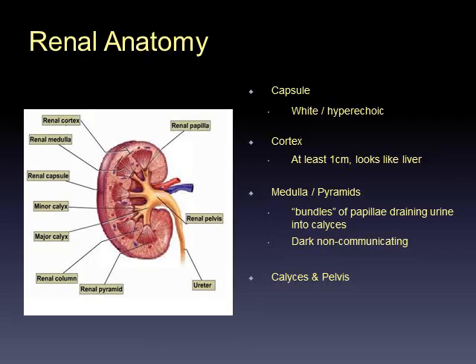The important thing to point out about these is that they are discrete segments that drain a wedge of the cortex. As such, they don't intercommunicate, which is important for scanning and distinguishing it from hydronephrosis.